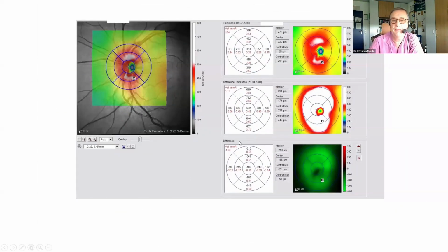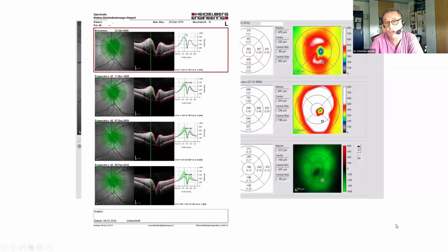For example, this is a patient encountering a change of the volume of the optic disc, and this change in the volume scan can easily be shown by the volume measurements and by the topography of our optic disc. And here the OCT is very helpful, also showing us very small steps of change. When you look at the star scan, you will realize in this event-based graphic how this flattening of the optic disc takes place under therapy.